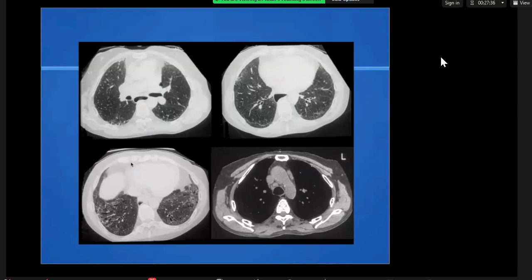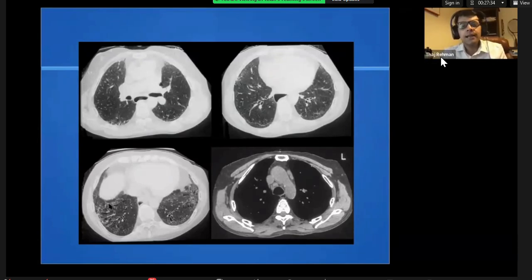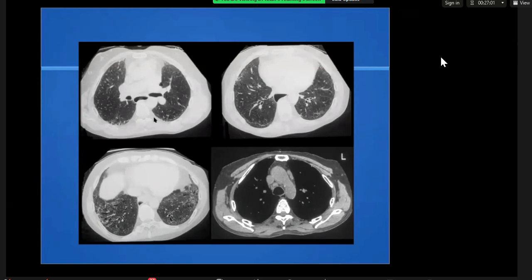Very good. So when you are presented a case of interstitial fibrosis, usually in the exam setting, there will be other clues to make a complete diagnosis. One of which is a distended esophagus in the case of systemic sclerosis. The other would be erosion of the clavicles in the case of rheumatoid arthritis, or these could be pleural plaques, in which case you can make a diagnosis of previous exposure to asbestos, because the lung disease is called asbestosis. Is that okay? Good.